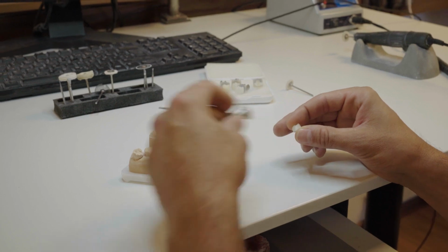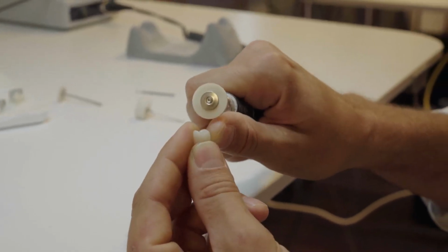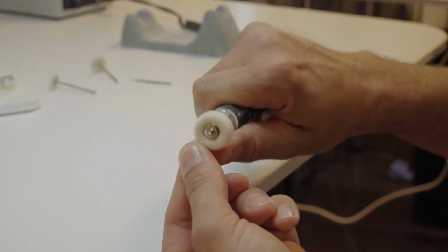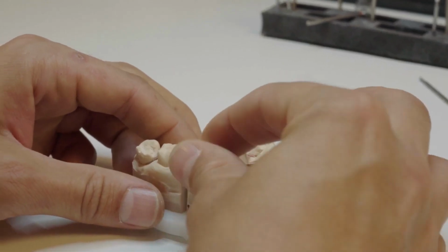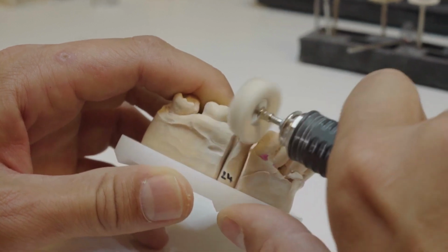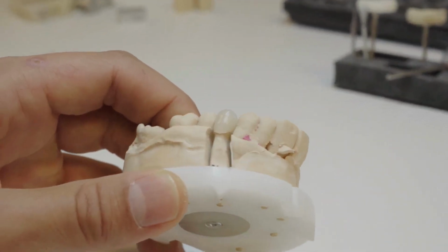Decisive for me as a technician is the uncomplicated and simple polishability of the Edelweiss block. With other blocks available on the market, in order to achieve a perfect gloss, you lose the surface very quickly, and the time spent on the construction to achieve perfect contacts was for nothing. I don't know of any other blocks that can be finalized with soft brushes made of goat hair and cotton to a lasting shine.